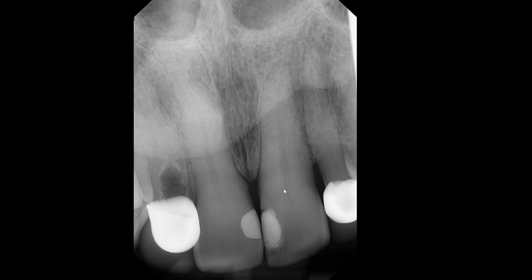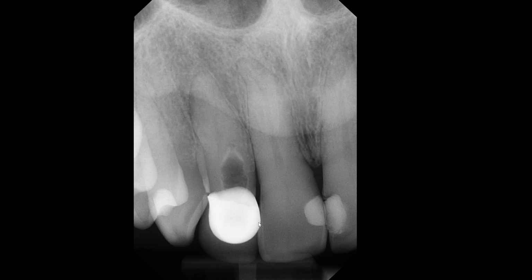There are a couple of things I think we can consider, and I like one over the other. I think we have to strongly consider dens in dente, because of that radiopaque line. What I don't know is whether there was a history of restoration, or whether some type of radiopaque liner or composite material was placed into this area. But presuming that no restoration has been done to address this area, dens in dente would be my number one differential diagnosis.